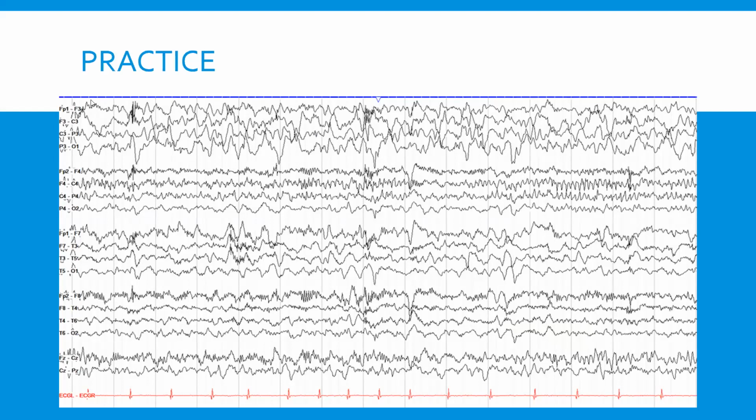Okay, let me start over. This is 3, so if it's 3, that means it's on the left. If it's 4, it's on the right. I realize I'm going really quickly, but 3 is on the left, 7 is on the left. So all the left stuff is very slow. All the right stuff is very fast. Okay, so I hope that's clear.